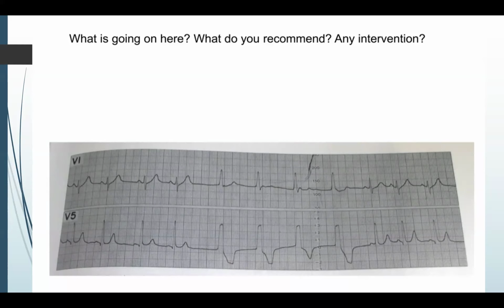If we look at the sinus rate, it's varying a little bit, but there's no P wave. So this is sort of like a ventricular escape rhythm because the sinus P wave came in late. There's a suggestion that maybe somewhere in here there is a P wave that's happening during the QRS. Similarly here, eventually the sinus rate accelerates and takes over again. So, anything you would do about this? This is a Zio or a Holter that was placed for an unrelated matter, and you just noticed this happen at 3 in the morning in this 14-year-old patient.